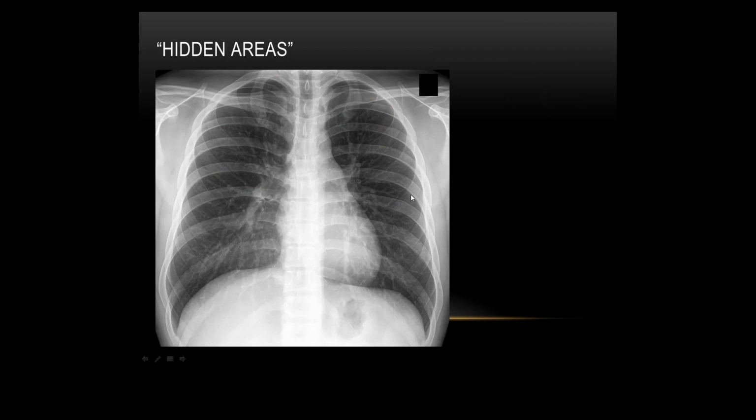That's my way of looking at a chest X-ray. Like I said, it does take some time getting used to looking at it over and over again, and it does seem tedious, but it does get quicker and quicker the more you use it.